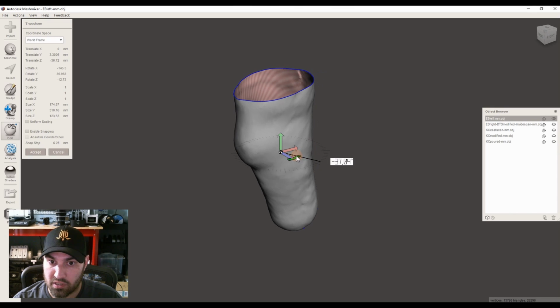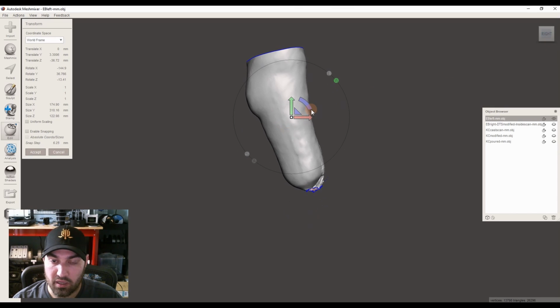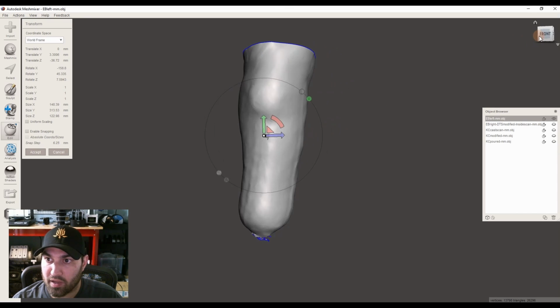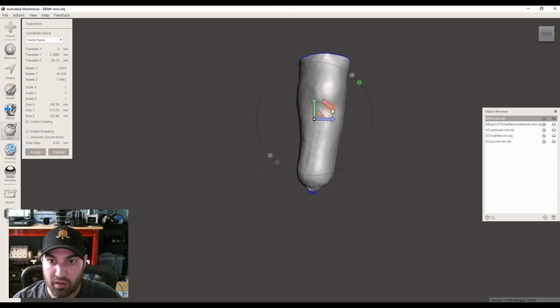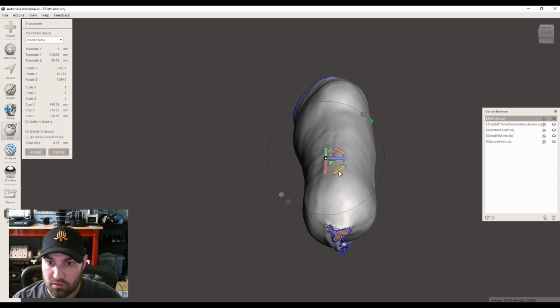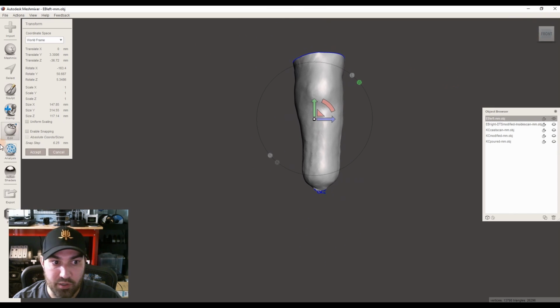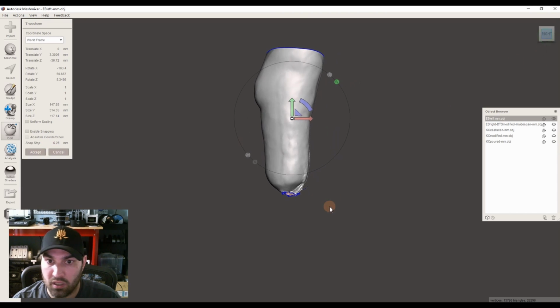So let's twist this one into position. And I just click back and forth between the views. So general navigation here, we covered a lot of that in the first video in the series. So check that out if you haven't. If there's anything that's not making sense here to you, it might be covered in that first video. So we've got that in position now.